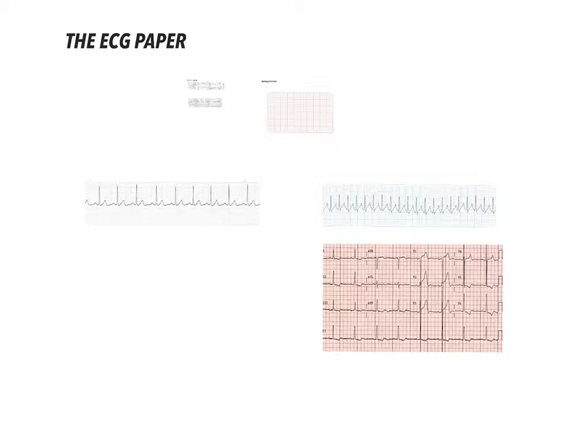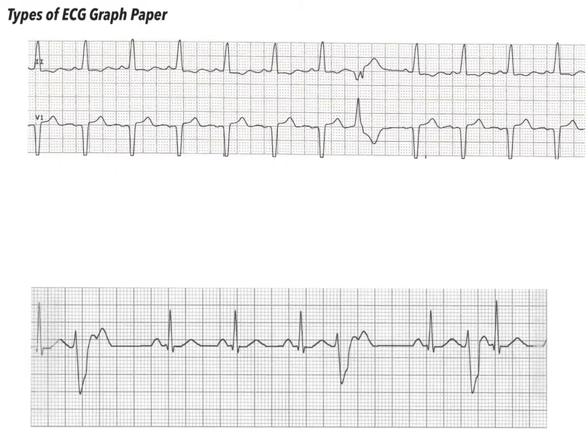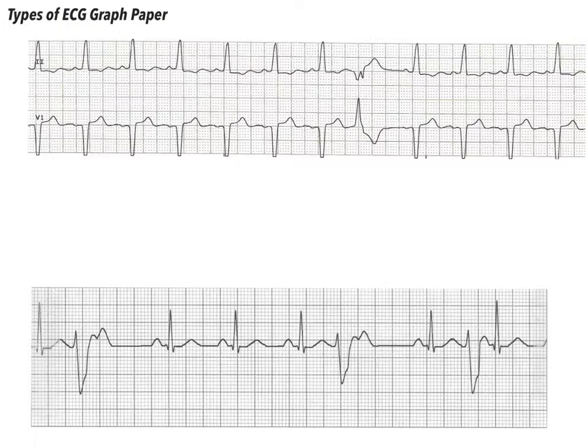that as you flip through the book and as I'm showing you examples on the PowerPoints or through Google on the projector, you're going to notice that there's different types of paper that you're dealing with here, okay? In the end, they give us the same measures, they tell us the same things, only for some of us, it might be harder to interpret from one type of paper than the other. For me, for example, that was the case. I prefer one type over the other, but in the end, whatever paper we've got is what we've got to interpret from, okay? So look at these two types.